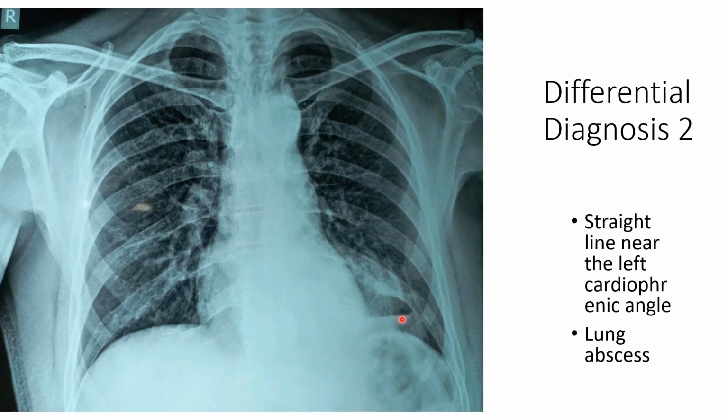So in lung abscess also you have a cavity with a sort of air-fluid interface. This is a lung cavity. As I said previously, in nature it's very uncommon to have straight lines, especially in the human body. Perfect straight lines are quite uncommon in X-rays. So when you see a straight line, it's something abnormal. So here is this lung abscess.